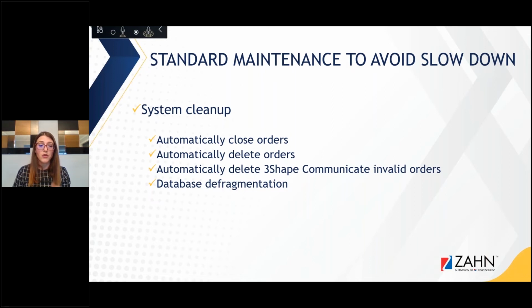So you can test it out, or maybe you already have noticed where if you move a file, you can still search for that case in 3Shape. It will still be there. If you click on it, it will have the little exclamation point that says files are not available because they've been moved. However, the case is still there. So that is what slows down your 3Shape. Not the files being in your C drive, it's the cases being in the database, which is in your actual software. So to clean up the database, the cases have to be deleted from 3Shape, not from C drive.